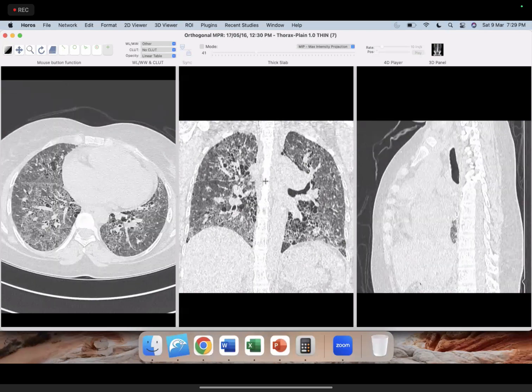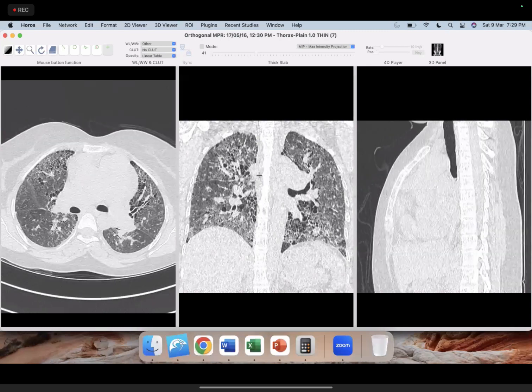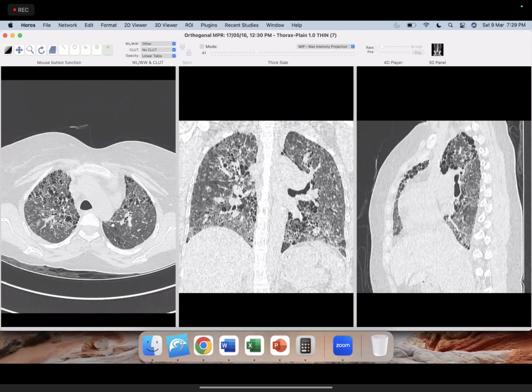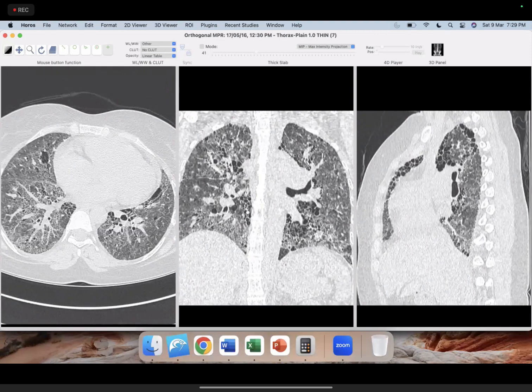You see a bronchocentric distribution and an upper lobe distribution of the reticular opacity and honeycombing, and plus you see significant ground glass, right? It is almost diffuse ground glass involvement. And can you appreciate the interstitial nodules? I think in the upper lobes you can easily appreciate them on both lungs. Practically almost everywhere they are present, but these are the areas where you see them more commonly. So you see nodules also.